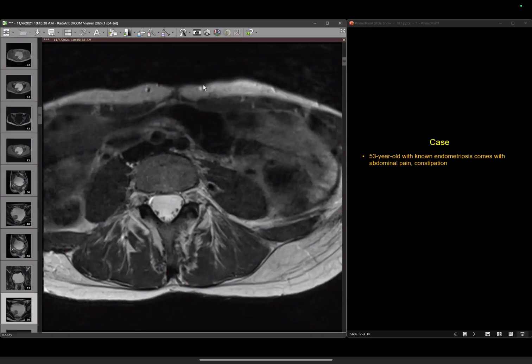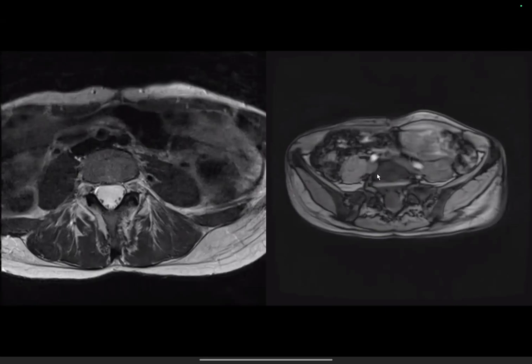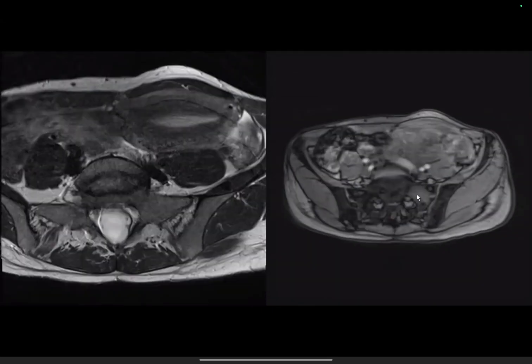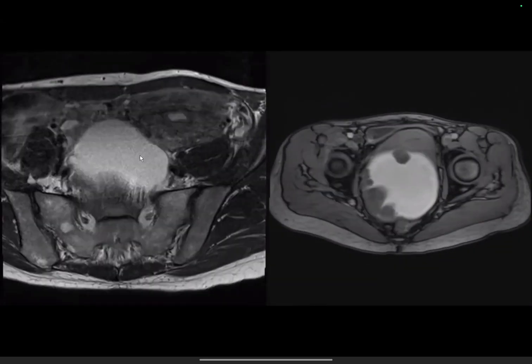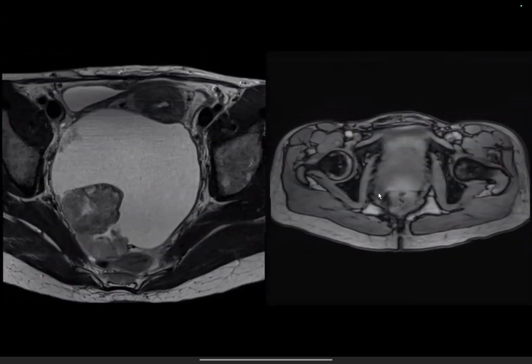We will try. Okay, perfect. So as we typically do, I'm going to first show you. Let's see if I can do this. Sorry, 1 second. Okay, so what kind of an image is this? Post phase. Yeah, so some kind of a T1 gradient echo, right? So this is a T1, and on this side is a T2 weighted image. Okay, so now what do you see?